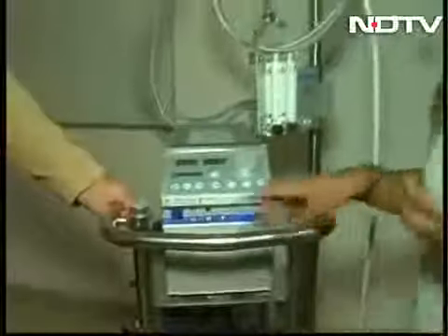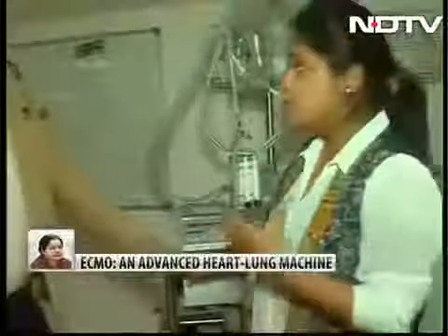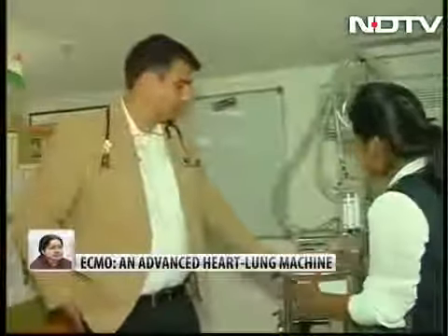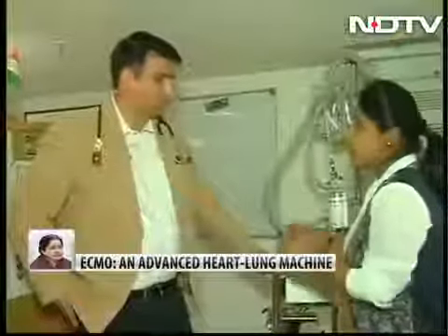I'm now joined by Dr. Raj Kumar, who's a specialist in ECMO. Dr. Kumar, can you please explain to us what ECMO is and what it does?